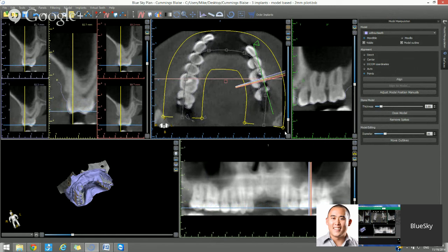Now, if you see a discrepancy, the first thing you should do is redo the points. Go back in, put down more points, spend more time placing them accurately, and better distribute them. Okay, that should solve the problem. A merge shouldn't take more than 3 minutes or 5, let's say if it's more complicated than 5 minutes. But you want to find points that are clearly defined.